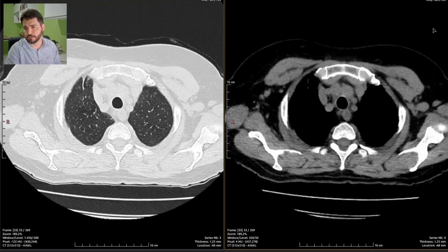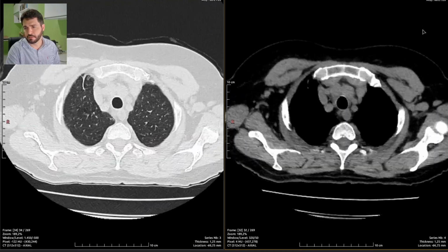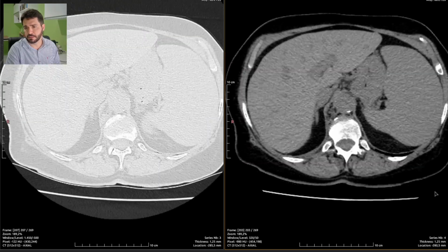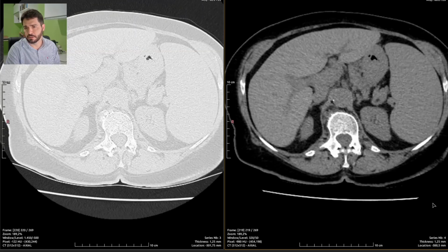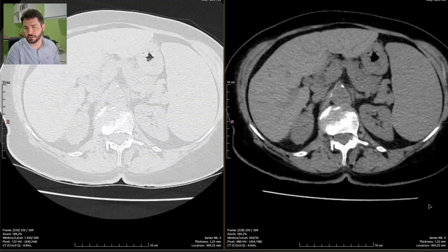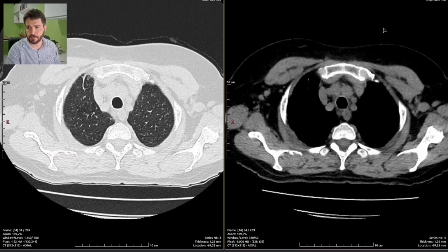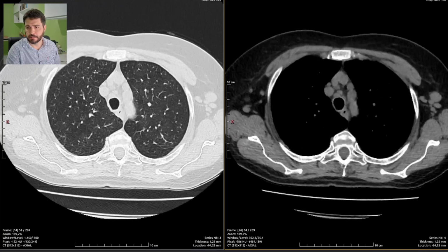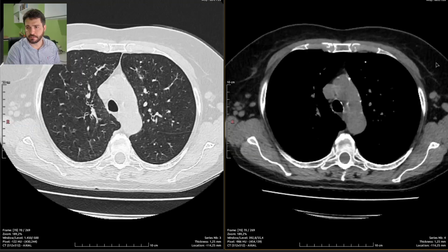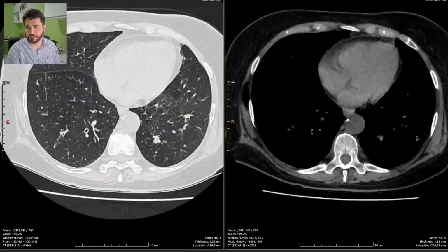The thing that concerns me the most are these enlarged lymph nodes all over the place, especially on the axillary region. This isn't common. This is quite uncommon and usually related to much more severe, deadly disease, such as neoplastic syndromes related to the lymphatic system.